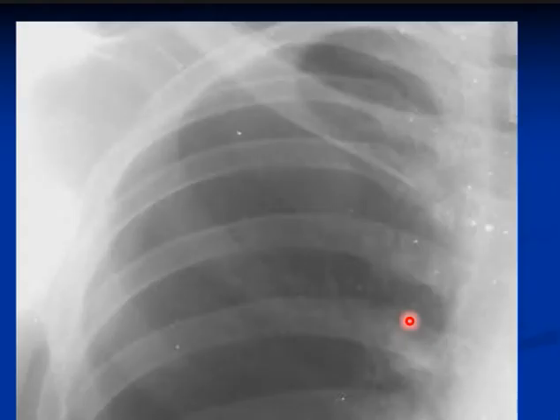Now let's see the chest. This is a magnified view. Do we have anything here? Calcified foci, look carefully. There is a pneumothorax, a lucent line with no lung markings distal to it, confirming the pneumothorax.